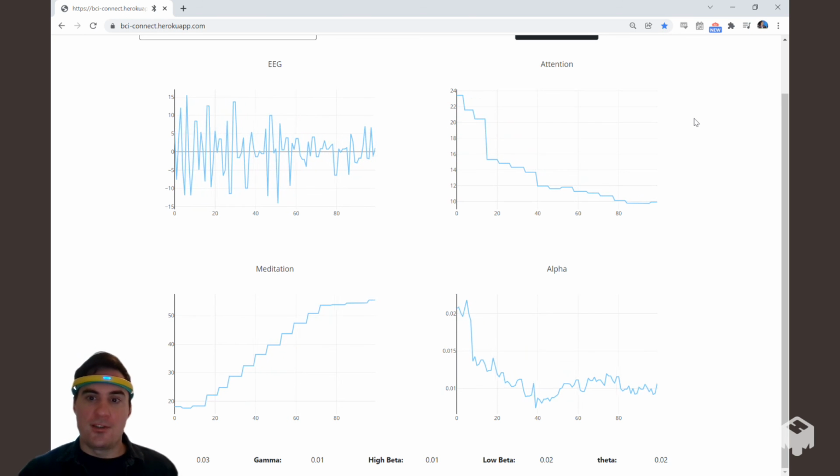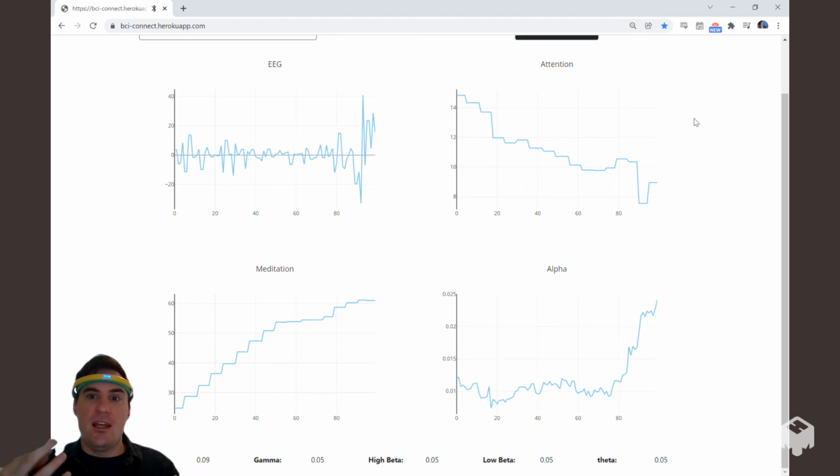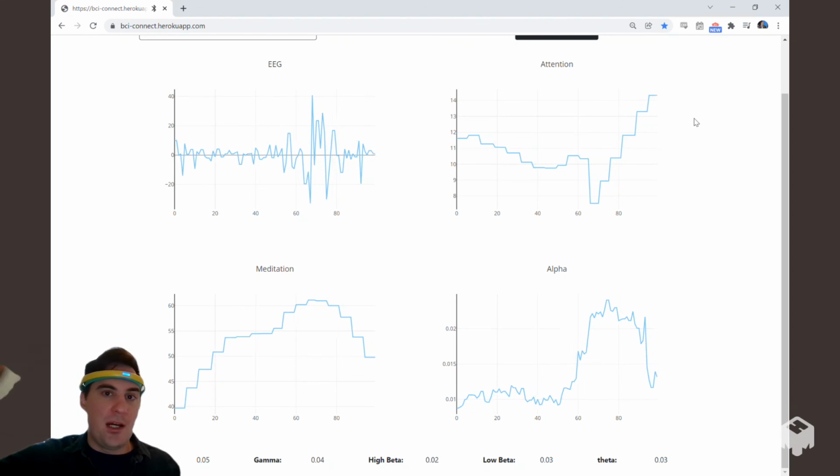There, I'm doing pretty good. So we're down to a 10. As I start to talk to you again, I'm going to re-engage. We're going to give this a little bit of time. You're going to see this attention algorithm creep up bit by bit.